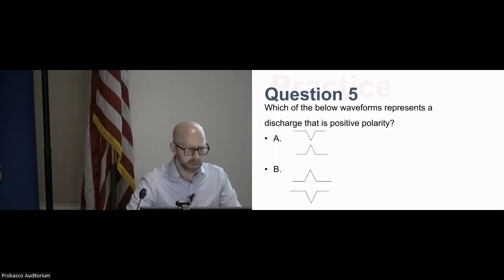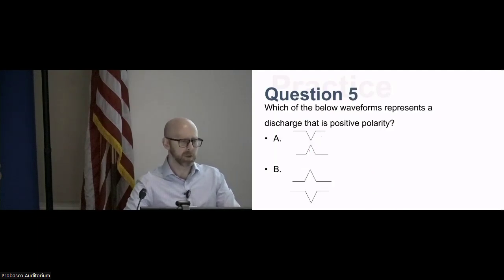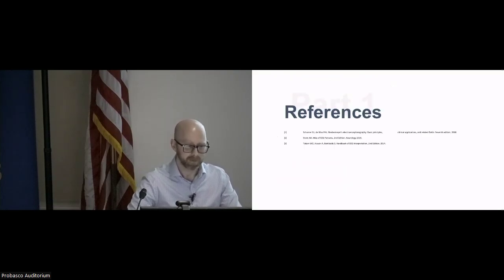And then what type of discharge between these two is a positive polarity discharge where you could just put that plus sign right in the middle of it? Yeah, B. There we go. And some references for that.